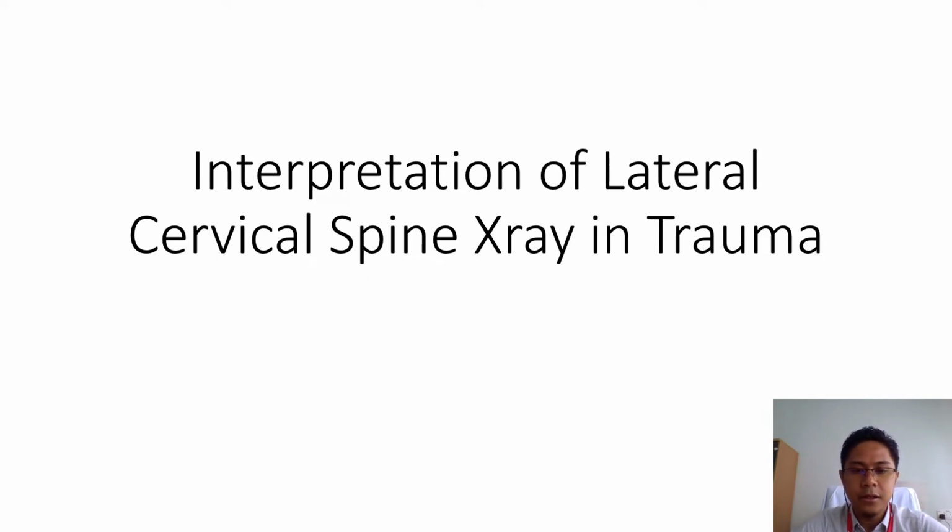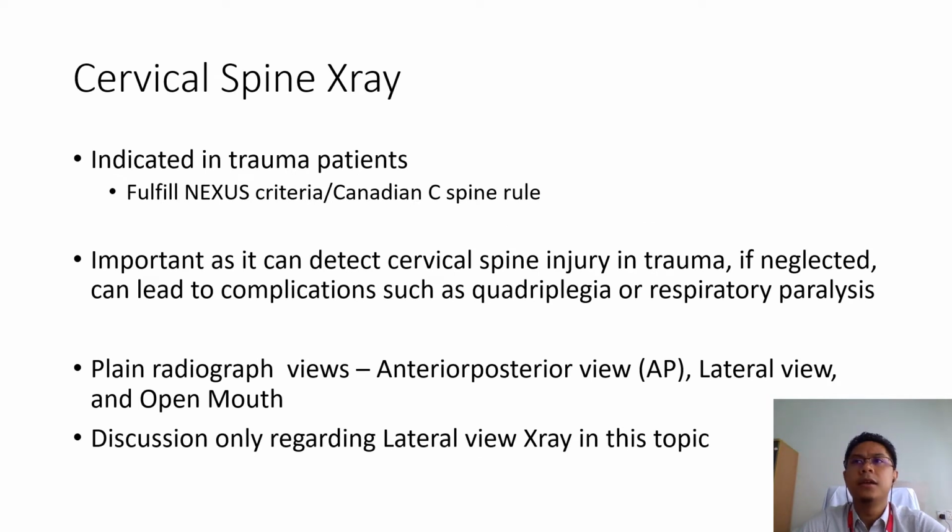So today I want to present this module, which involves the interpretation of lateral cervical spine X-ray in trauma. As we know, lateral cervical spine X-ray in trauma is quite important, especially in the primary survey as an adjunct, where we can detect abnormalities, suspected fractures or any misalignment of the cervical bones that will help us in managing this patient further.